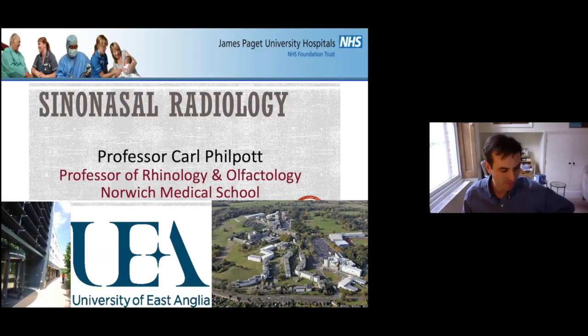But hopefully I'll impart some of my wisdom on CT scans and MRI scans for sinuses, on particularly radiological features that you need to be aware of in respect to sinus surgery. Right, couple of slides, here we go.